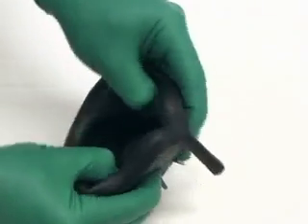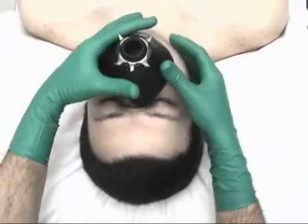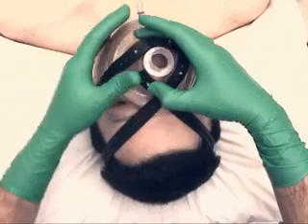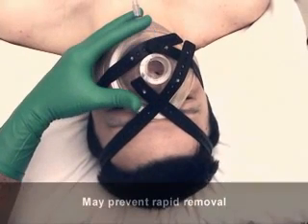Some masks have a malleable body, which can be molded to the face, thus reducing dead space. Masks equipped with a ring with hooks can be used with a mask strap to better hold the mask on the face, but may prevent rapid removal of the mask, for example, when suctioning the oral cavity is necessary.